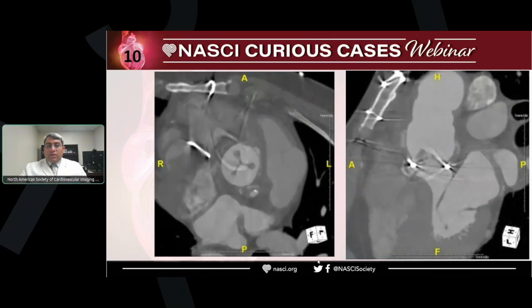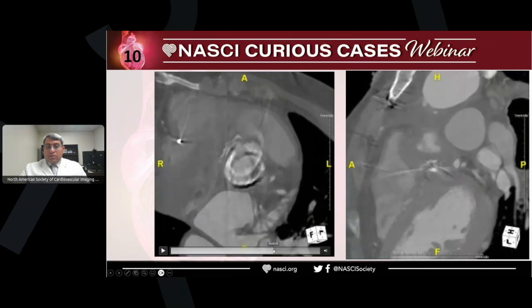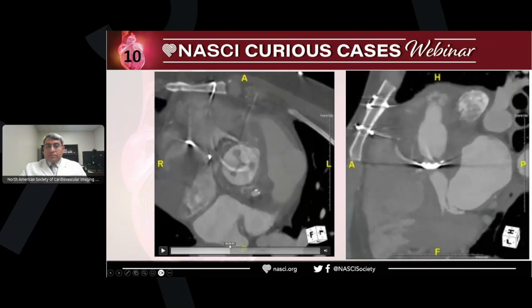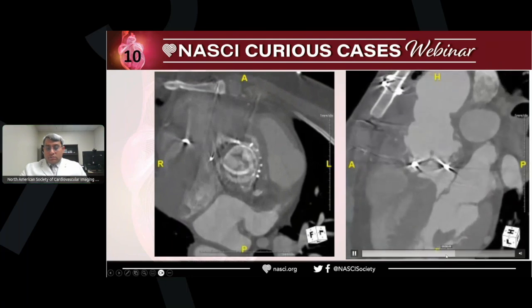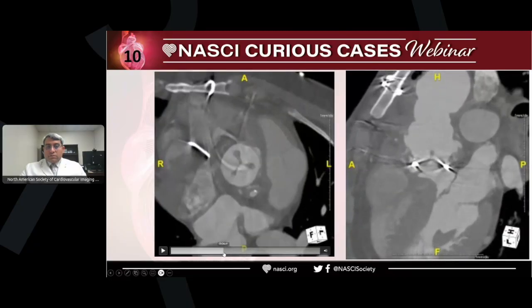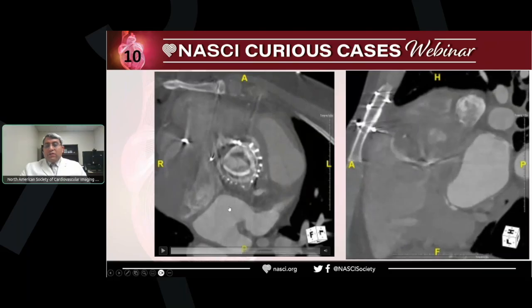Maybe a difficult case. Does the patient have any particular symptoms? Because what I'm seeing is focused on the aortic valve prosthesis. Right. Maybe the leaflets are a little thick, and I think under that, is it the right? There may be an aneurysm. So I'm wondering if this is endocarditis or... Yeah, trying to figure out, maybe.